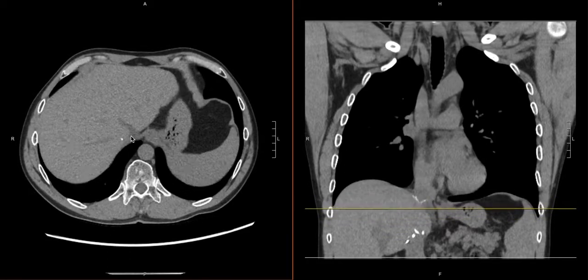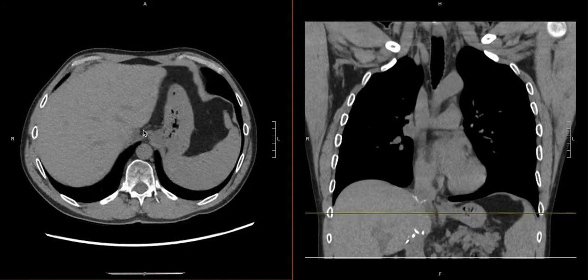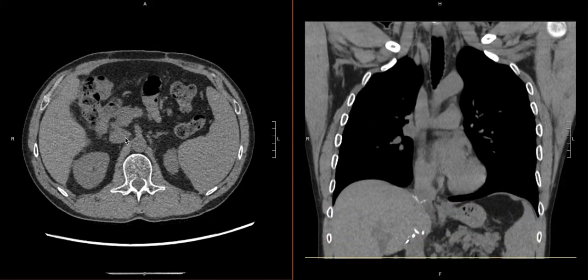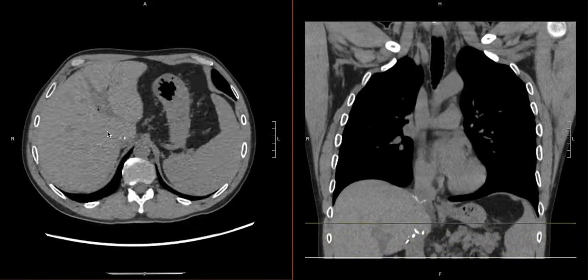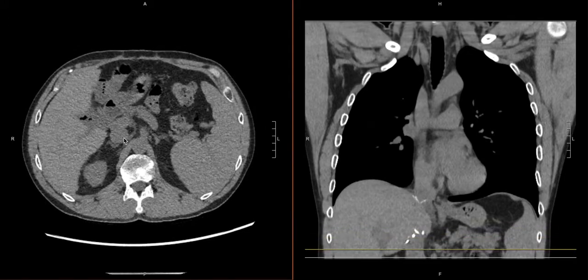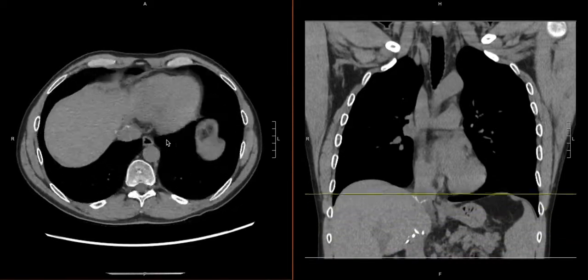You may be able to see some of the hepatic veins coming in with some of the natural contrast between the hepatic veins and the liver parenchyma. And then similarly, if you go down, we really don't go low enough, but this is still IVC here. You may see things like renal veins. You may see portal vein. So it's just useful to realize kind of where the pathology is, even on a non-contrast study, and be aware that you can get some evaluation of the venous structures.